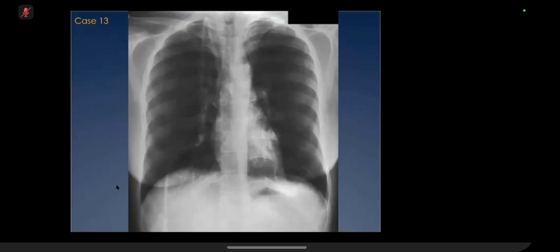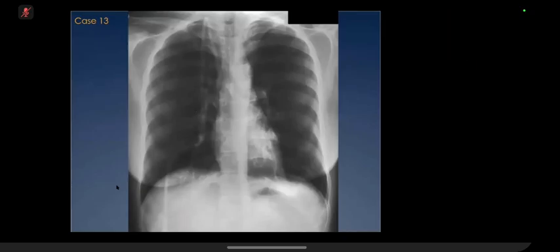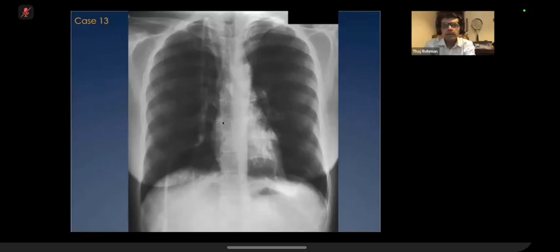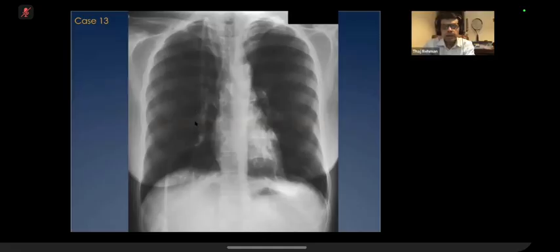It's a frontal chest radiograph with a central line. I can see the central line in the patient, right-sided. The tip is projecting, I think. Yeah, ignore the central line, that's fine. So that means patient may be having a long-term chemo or antibiotic therapy. Yeah. Pick up the abnormality in the chest, in the lungs.